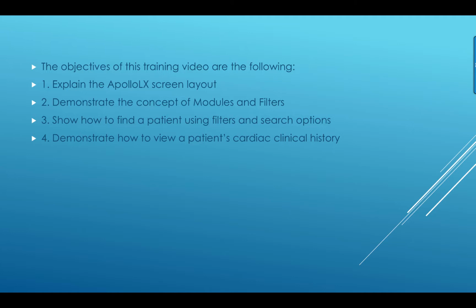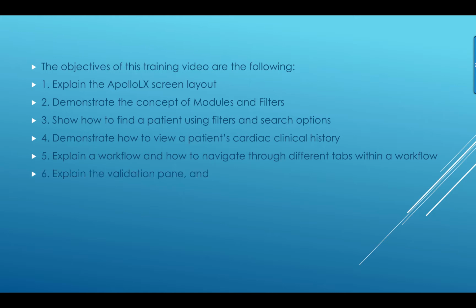4. Demonstrate how to view a patient's cardiac clinical history. 5. Explain a workflow and how to navigate through different tabs within a workflow. 6. Explain the validation pane. And 7. Show the main icons on the ApolloLX Toolbar.